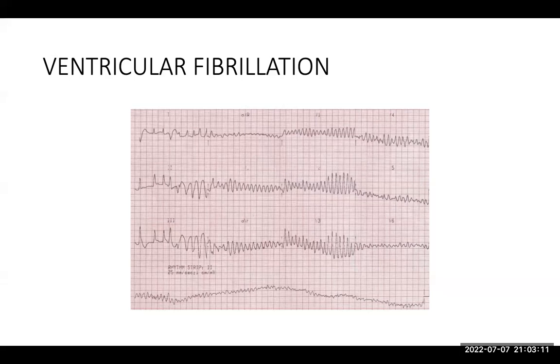or people who have hypokalemia. And by the time potassium is reaching a level where it's generating a U wave, that's a patient almost on the deathbed. But I know what the person means: if you see a U wave, how will you know if it's a different P wave or a U wave? And that's what I'm trying to tell you: you are already dealing with Mobitz type 2 or type 1, in which case what you are seeing you consider as a P wave. You don't consider it as a U wave, because right now the important thing is to confirm the diagnosis of Mobitz type 2 or type 1.